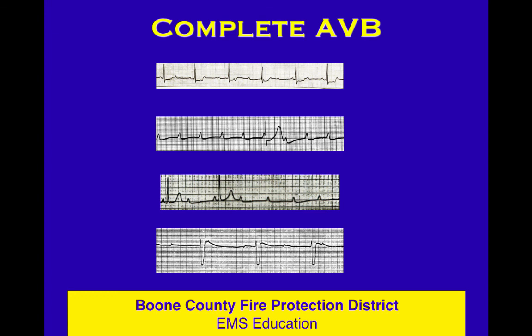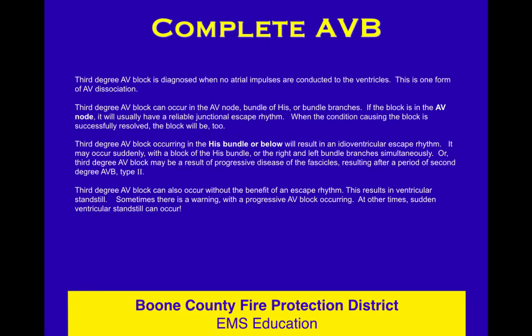What are the P waves doing? What is the atria doing? March it out, look at it, and then compare it to what's going on with the ventricles. Another big long slide. Got a lot of good information. I won't read this to you.